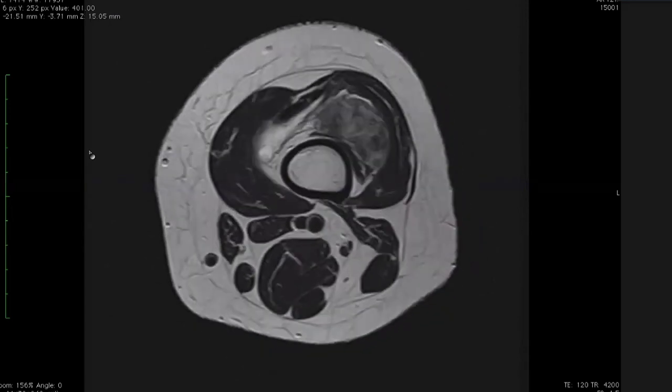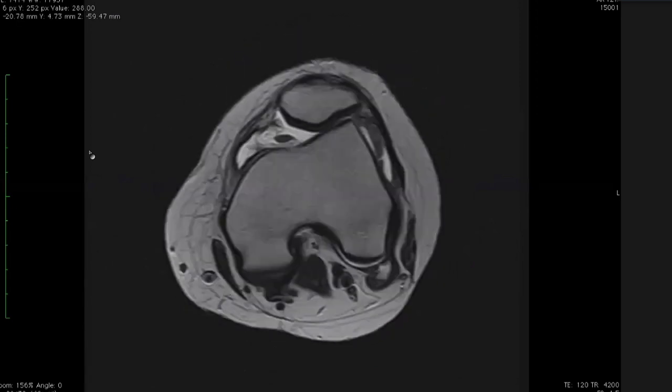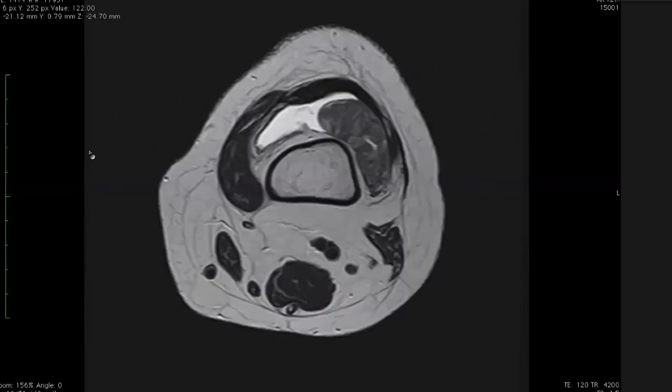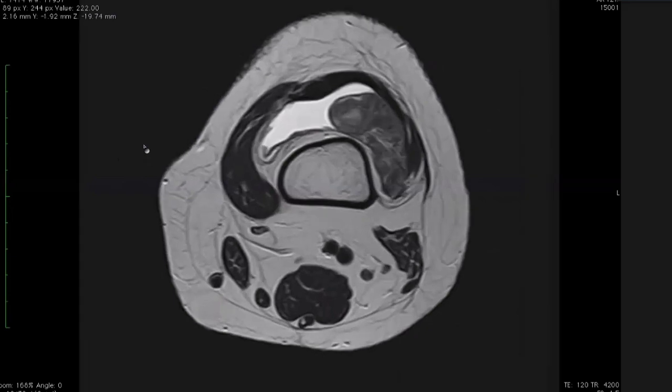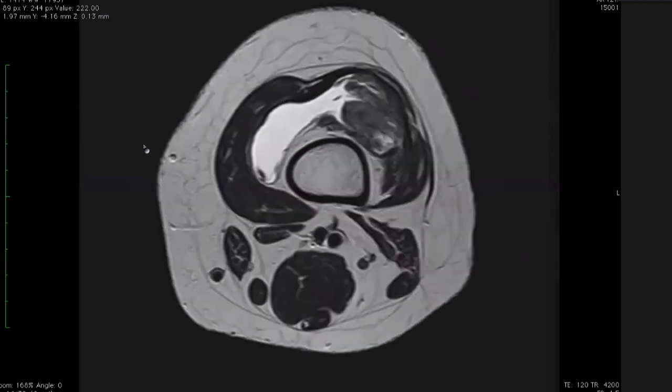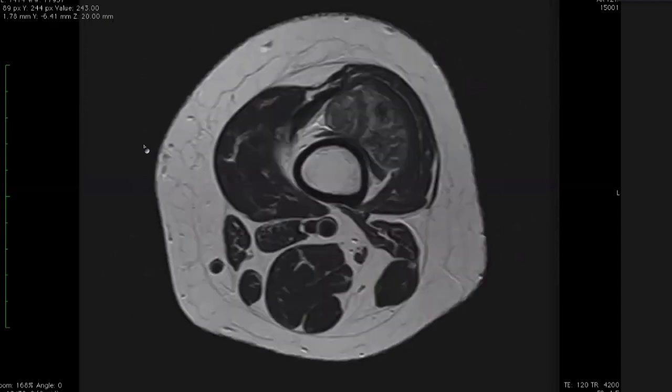So this is a T2 weighted image. Do you see any abnormality? There are multiple hypointense lobulated foci in a group form noted within the joint space, and these appear hypointense, and it could be PVNS. What is PVNS? Villonodular synovitis.